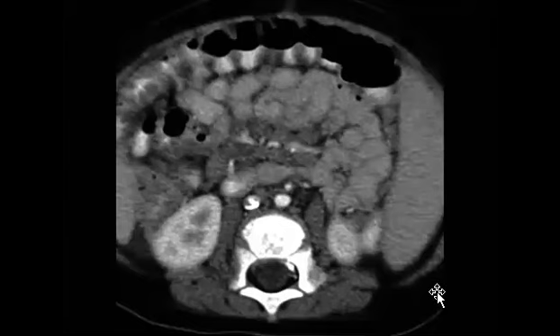He can show you again the thickening of what here? What could this part be? Maybe, but I think maybe transverse colon because the folds don't reach.